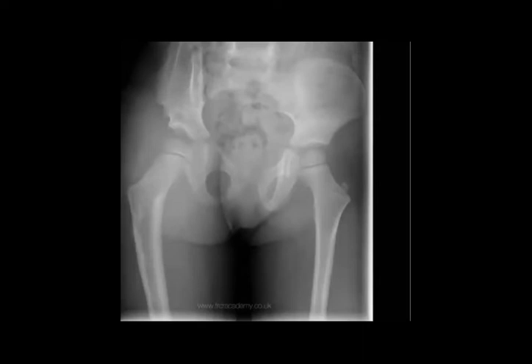Again, this one I think is a bit difficult. Not difficult, inshallah, but we mentioned that when you have a pediatric patient with a pelvis, you will think about either Perthes, or other two or three differentials, what they are. Try to apply the lines. I give you the clue now.